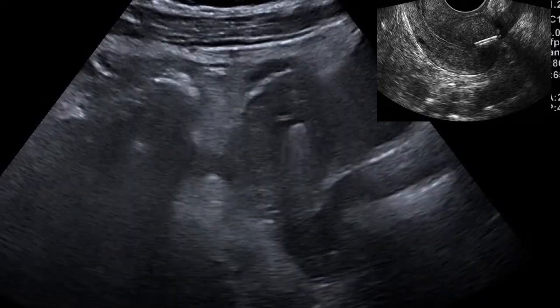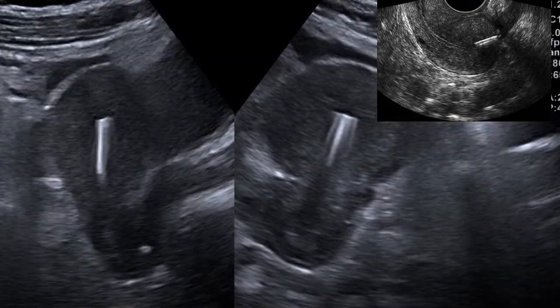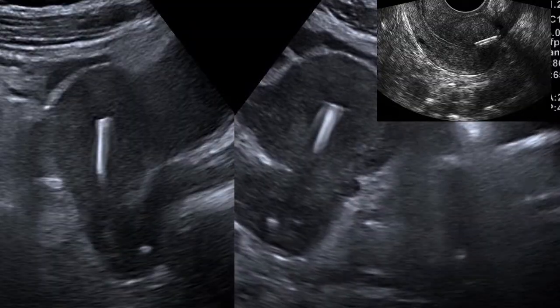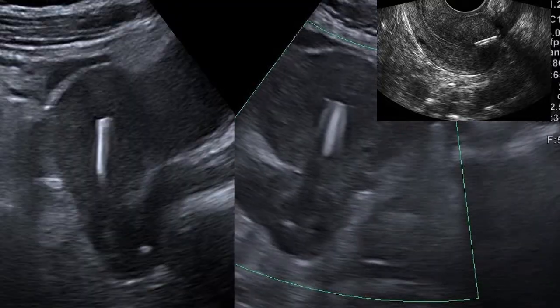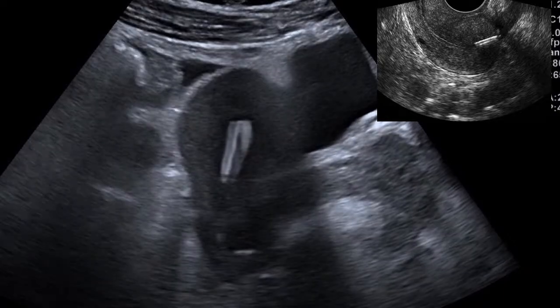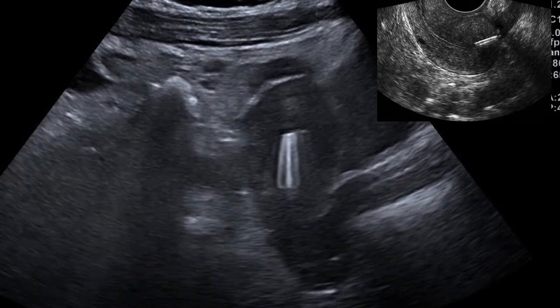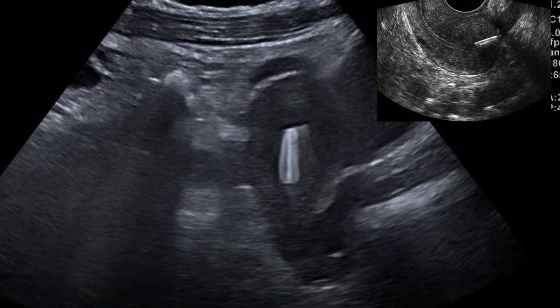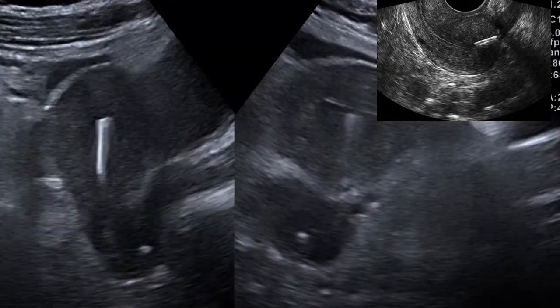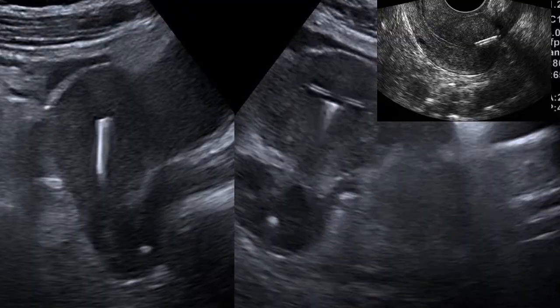The first thing you're supposed to do is identify the uterus, then also the size and the contour of the uterus. You have to make sure that the contour of the uterus is smooth and there are no other confounders. The uterus in this case looks homogeneous. There are no fibroids that I saw, and I didn't see any sonographic sign of adenomyosis. The other thing you're supposed to do is to assess the endometrium, then the fluid, if there is any, or any retained products or endometrial masses. Those are some of the things you ought to make peace with.